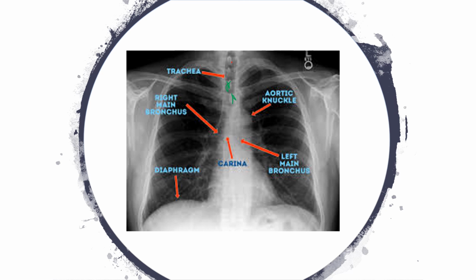And so the big thing with seeing those is it allows you to know that the patient was aligned perfectly. Because let's say that this patient was faced towards their left, right? Well, the heart is on the left side of the thoracic cage for almost everyone, and so the heart's going to appear bigger if they're faced towards the left. Then you're thinking, oh, this patient has cardiomegaly, they could have congestive heart failure. If the patient's rotated a little bit to the right, that means the heart's going to look smaller than it normally is. So if a patient does have heart failure or cardiomegaly, we may not be able to pick that up. So that's some of the things that we're going to be looking at.